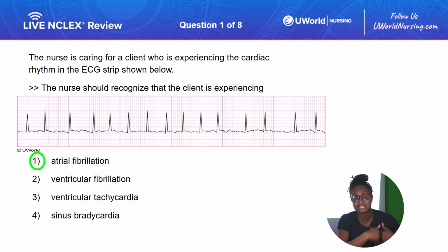The next part of the step would be, do I see a QRS wave? Which I do. And then, do I see a good PR interval? Well, since I don't see a P wave, that means it's more likely an atrial type of rhythm, since the P waves have to do with atrial contraction. So I'm leaning toward an atrial type of rhythm, especially since I can't measure a PR interval.